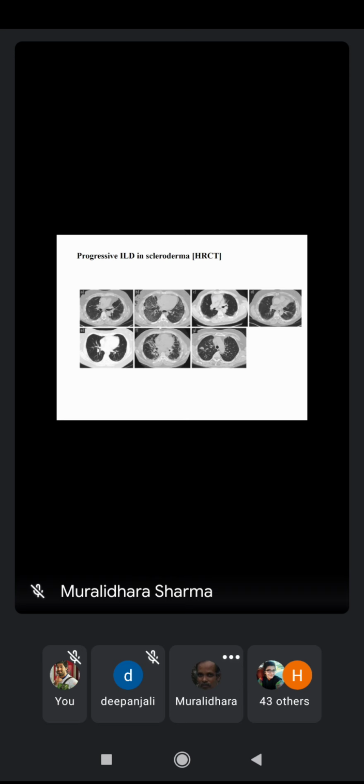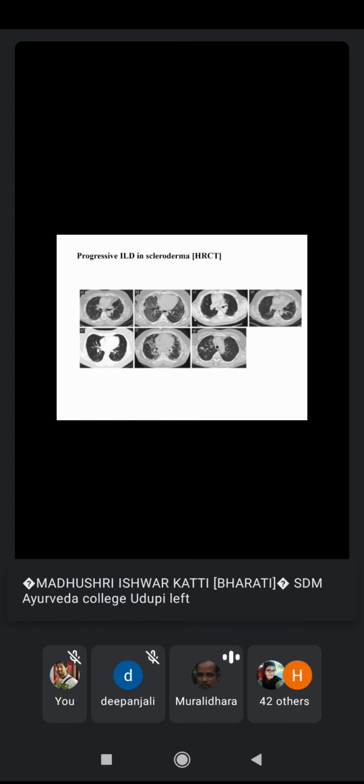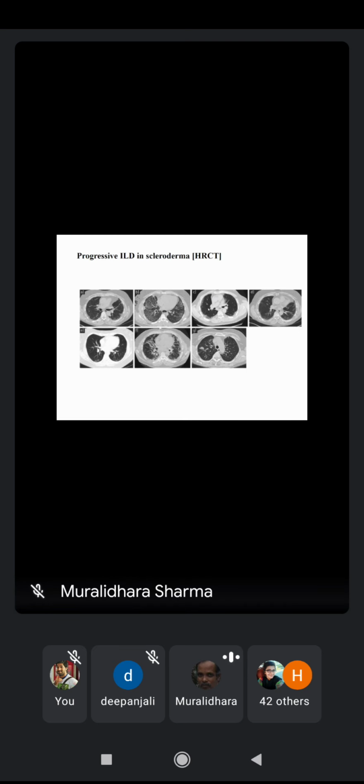Now, the high resolution images in the early stage can show you the same phenomenon, where the lung tissue has many fibrous band-like structures, and this is better seen almost in the same stage, same duration. In the moderate, usual CT image, those changes are not that conspicuously visible.